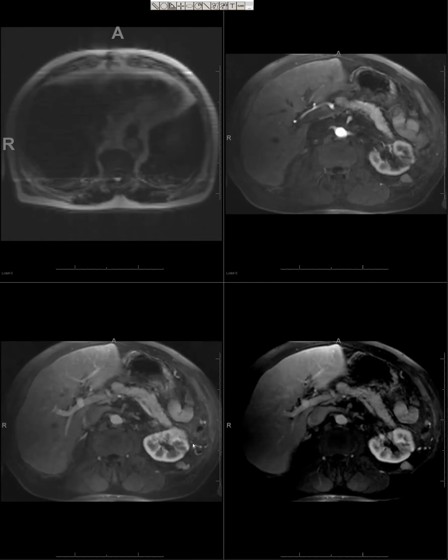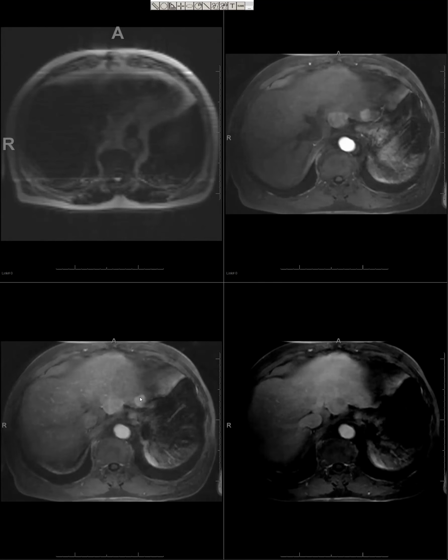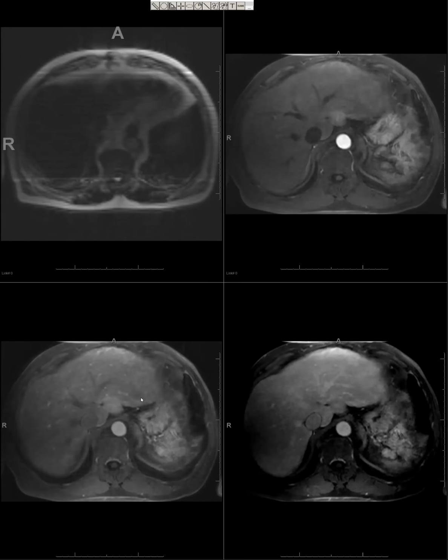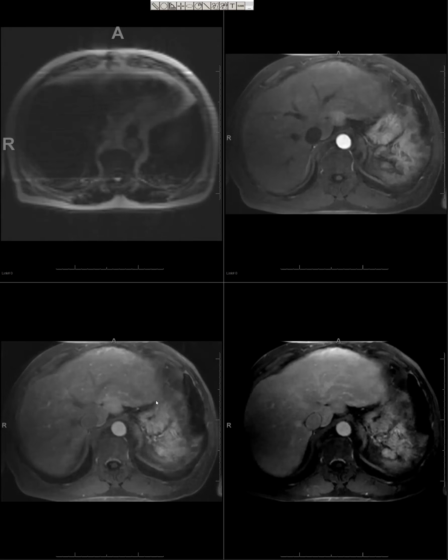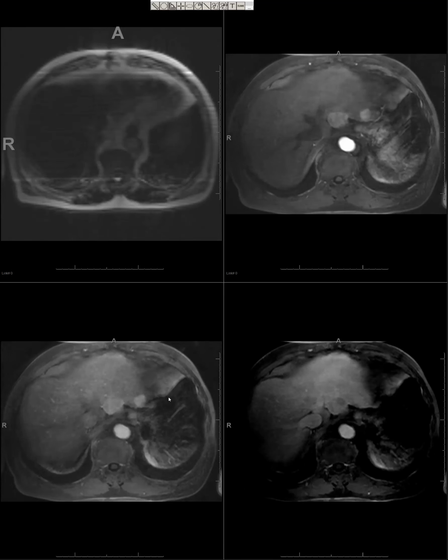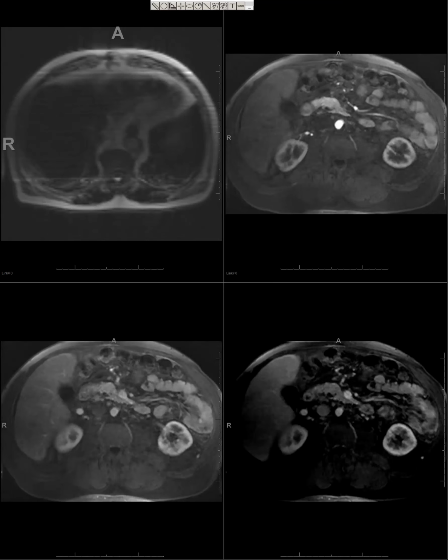Very nice. But it's easy to go wrong on something like this when you're not in the right mindset. To Aarti's point, these two are in the periphery as well, right? Yeah, and most of the splenosis is affiliated with the liver and the left lobe, which makes sense because it's easier to hop over there. Vicinity. Yeah, cool. Great case.